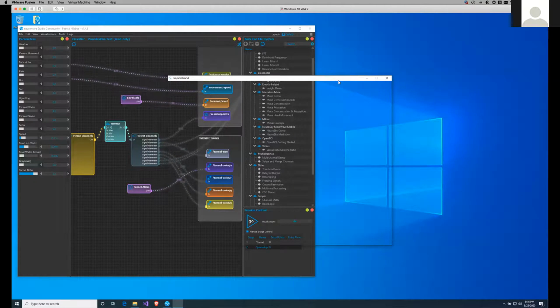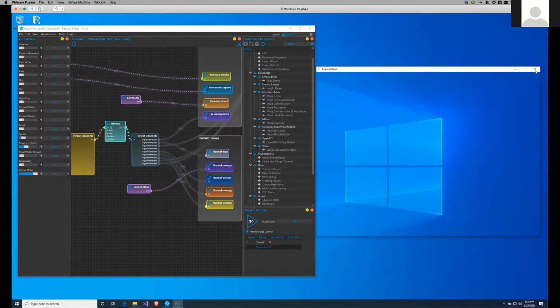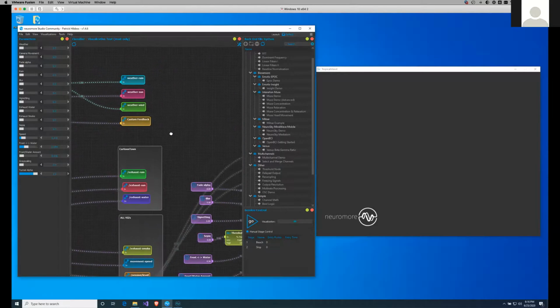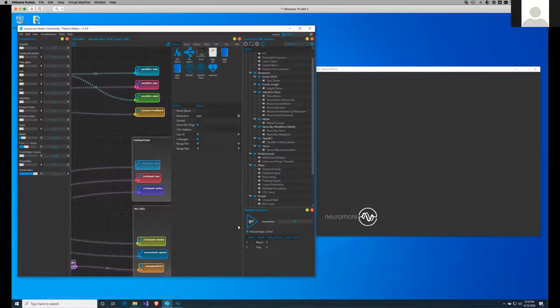So we can see that pretty easily. For those who don't know what OSC is, it's a protocol that you use for very fast communications. And if you see the slashes on the screen, Patrick can probably see how it's got slash exhaust rain slash. So that's very common. Anytime you see something like that, it's also common in web URLs too, but OSC is used for that too. Exactly. So all those feedback nodes are all grayed out because it's currently read only, but I will also show you in a minute how you can make it editable.